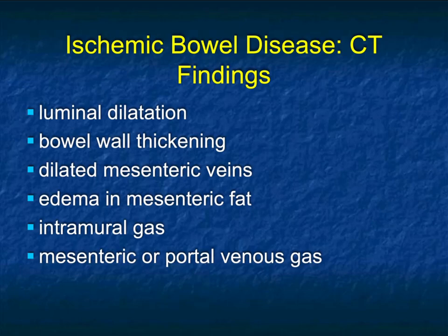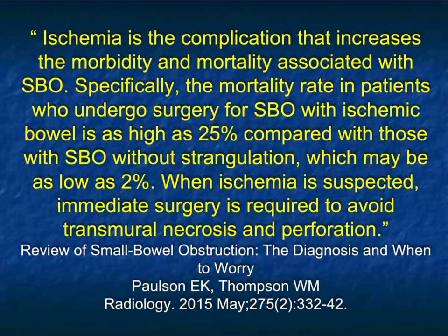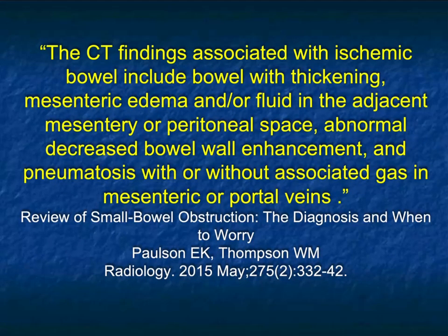I'm not going to talk about looking at the portal vein and SMV, which you need to do. Obviously, you also want to make sure the patient doesn't have any portal venous gas. And we talk about ischemia and the complication rate and the importance of diagnosis. I think one of the times when people miss things is when they don't study the vessels routinely, particularly early on in ischemia.